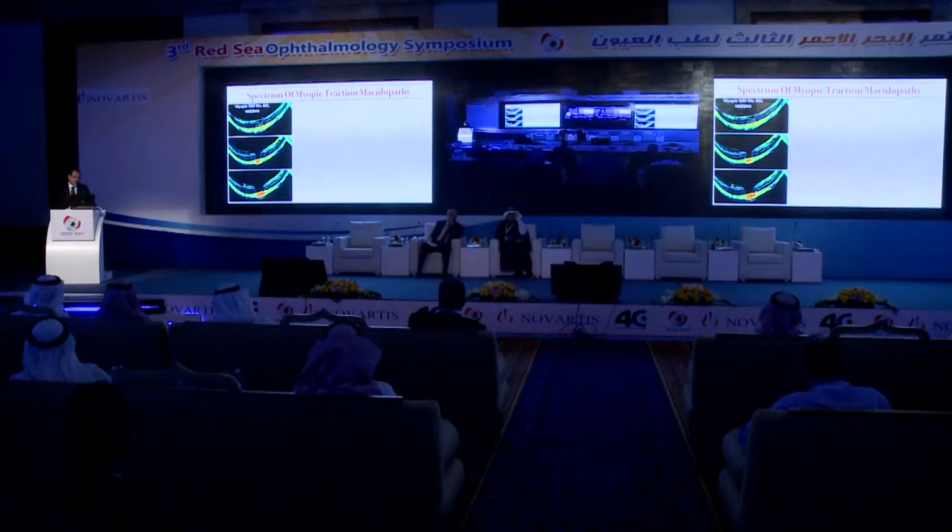Let us look at this patient with myopic foveoschisis and epimacular membrane in February 2011. Soon he developed a macular hole, and then the macular hole led to myopic macular hole retinal detachment. So every stage leads to the next stage.